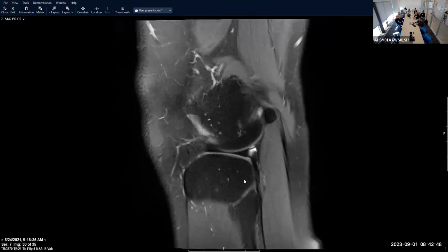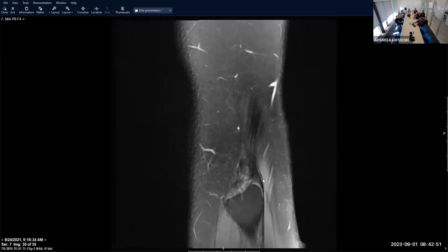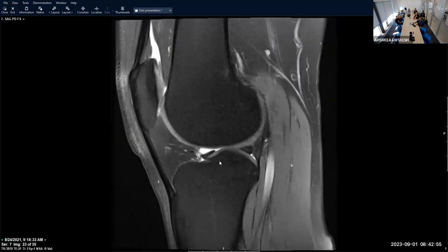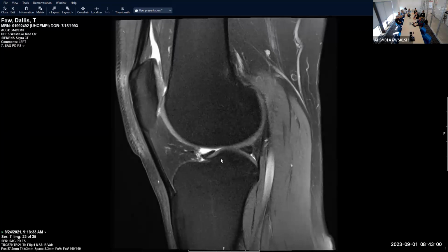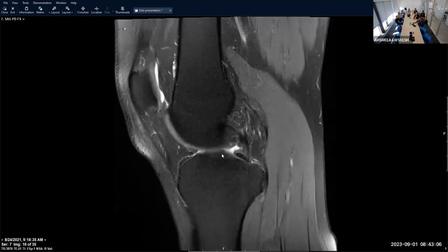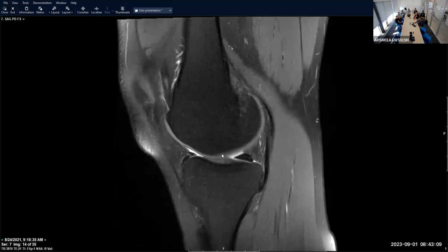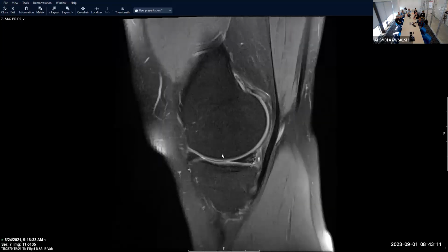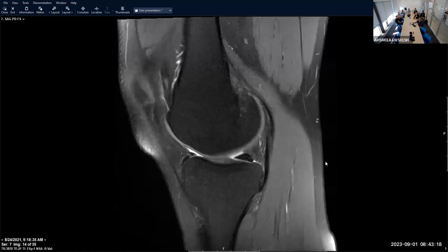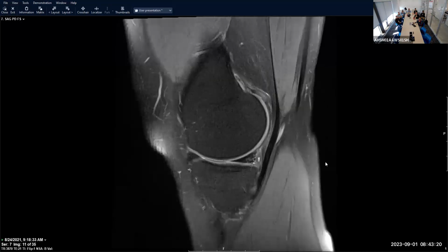All right, let's go again. I'm just going through from lateral to medial. So far, this also looks like a 3T. Yep, Siemens, Westlake. So we have 4 3Ts at main. We have 1 here, which is the Philips, the less ideal of the 3Ts, and then there's a Westlake 3T, which is good. All the other 3Ts are Siemens except for the Philips one here. Philips is fine, I wouldn't not send patients here. It's just not my favorite relative to the other ones.